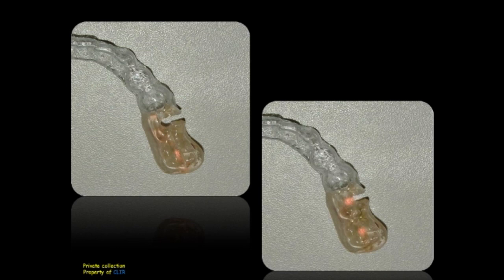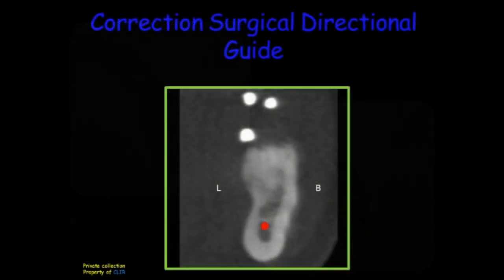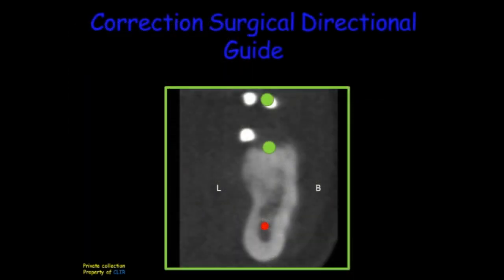In this case, we'll follow the new 2 points, okay? And our implant will be into the bony envelope. And as you can see, if we follow now the occlusal and crestal points, we'll be directly into the bony envelope after placing our implant.